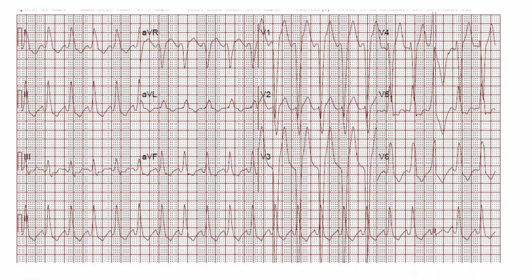So if you have somebody with concordant ST changes, so you have ST elevation in lead 1, or you have ST depression in leads V1 through V3, this is what we call concordant ST changes, same direction as the QRS. This is a STEMI. This is a very specific finding, the concordance finding, and implies a STEMI concomitant to the left bundle branch block. However, you may have a STEMI without concordant ST changes.